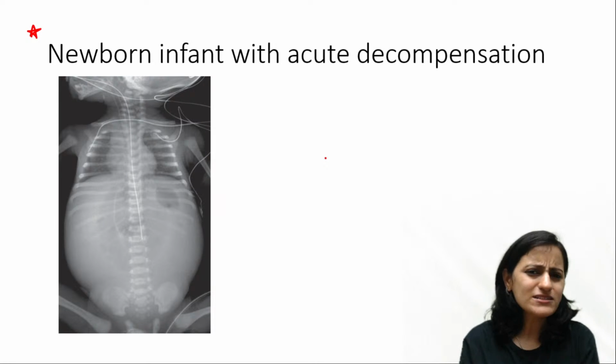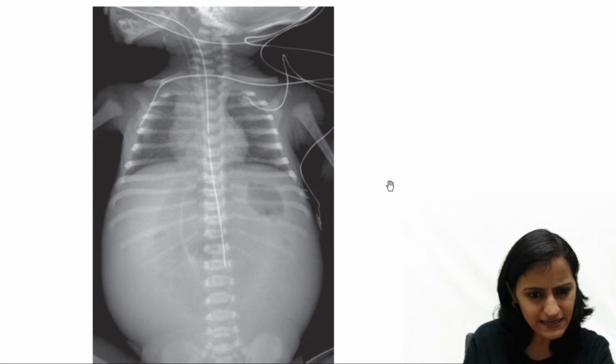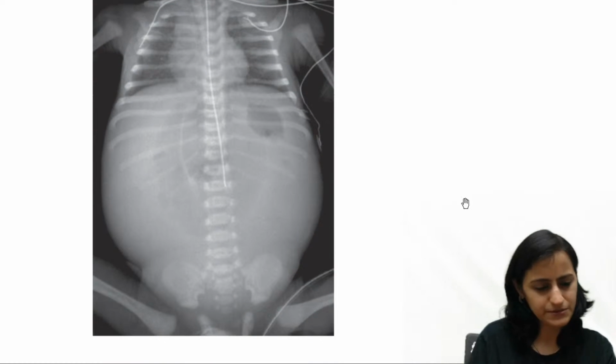So the diagnosis is simple, but the image might be a bit difficult. If you are finding it difficult to see the findings, let me zoom this image and see whether you can see any pathology here. Okay, so I am taking the image here. All right.